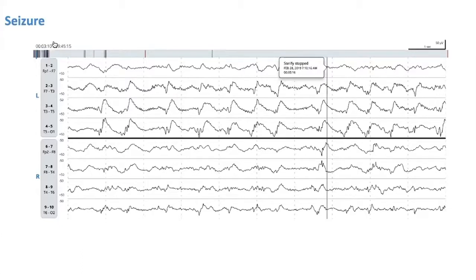Yeah. When we read EEG, we say, hey, look at this, it has a field. So what you are saying, John, is that if you had seen it only in this particular electrode and not in the neighboring ones, more likely it's an artifact, because this particular activity is a potential between 3 and 4.